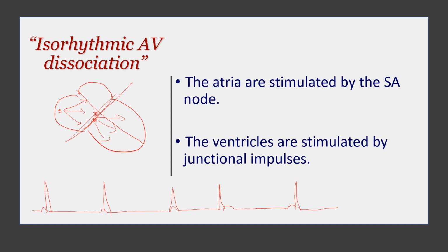So there will be a complete AV dissociation, but without a complete heart block, because you can fix this, and we will talk about how very soon. So this is the pathology of the isorhythmic AV dissociation.